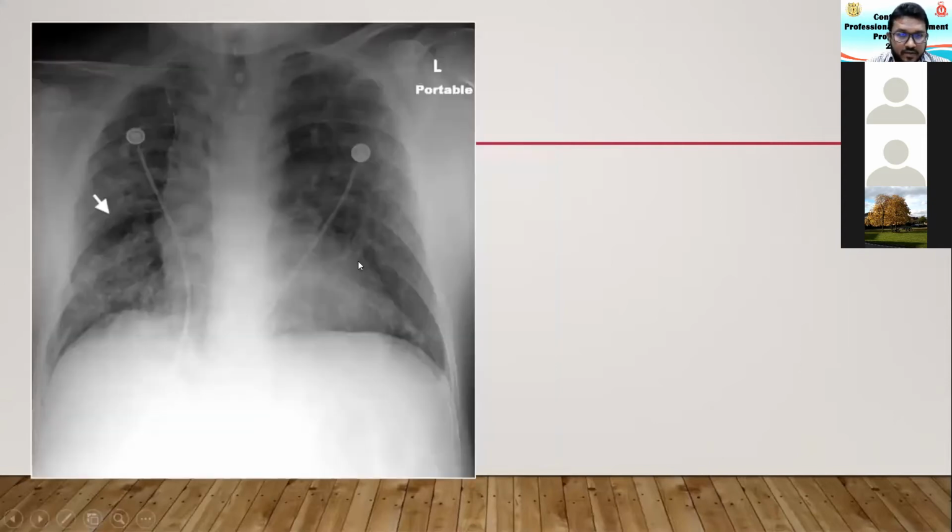Again, if you come to this x-ray, you go in again in a systematic way. The airway looks fine, the cardiac outline is fairly smudged but looks okay. There are multiple shadows on both sides, and you can see a tube line going in. This is an IC tube, and if you look carefully, you can't trace the lung markings up to the chest wall superiorly. So even with this IC tube, there is a residual small pneumothorax anteriorly, more superiorly on the right side.